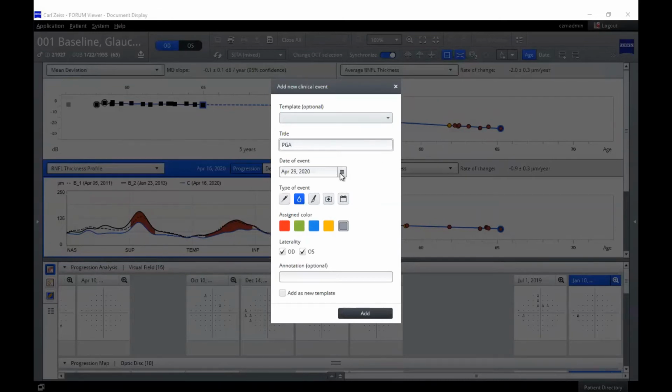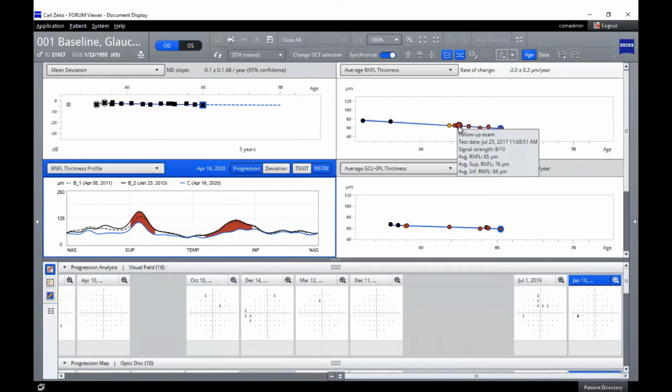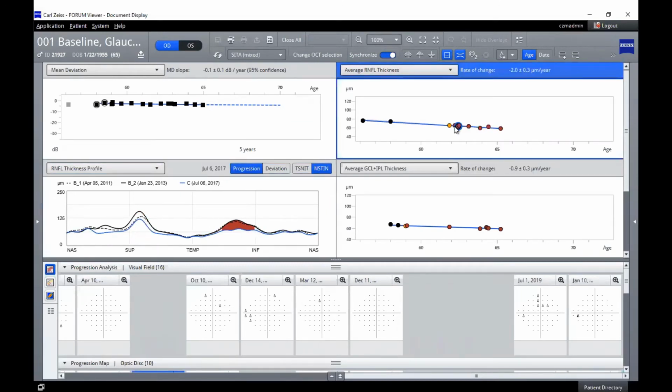We've got capabilities to add it just to one eye if we were doing a trial, but in these cases also to identify the date at which we are adding those things in. So this can be really useful once we add it in, because it'll help us on resetting the baseline and analyzing maybe where we've done something clinically with the patient. But I'll get on a particular case here and stay on a date as we add the medication here.